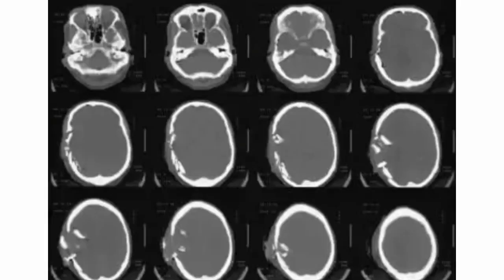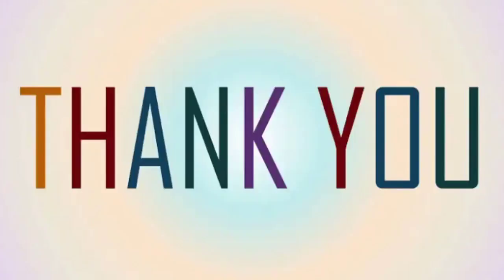The other things that can also be commented on while looking at a CT scan are the bones. Although a bone window is especially used for looking at fractures, in the brain window you can also see the bones, if any fractures are present. And sinuses can also be seen, but these are things related to the radiologist. So this was a brief review of the things that you should not skip while describing a CT scan.